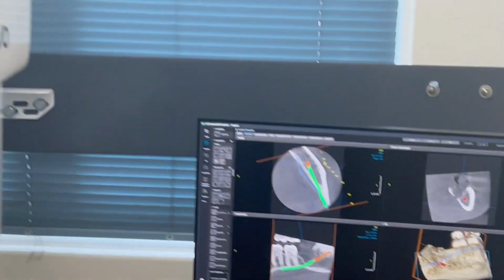So this sort of system's a great tool for general dentists. Oh, absolutely, mate. This is a bit of a technical case, but within a blink you can see exactly what's going on. The 2D's a great lead, but the 3D on these more complicated things can show you exactly what's going on. I use this for broken roots, broken crowns, pre-prosthetic work, periodontal work, general practice stuff every day, and it's a tool I couldn't work without anymore.